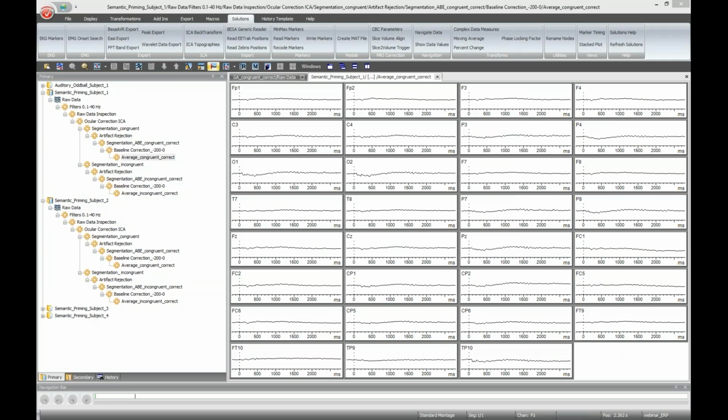Okay, now we have some more questions. How do I make an average ERP for several channels? I've tried using the pooling function. However, I can't overlay these pool channels to visually see the difference in the wave. The pooling function is the right thing, definitely here.